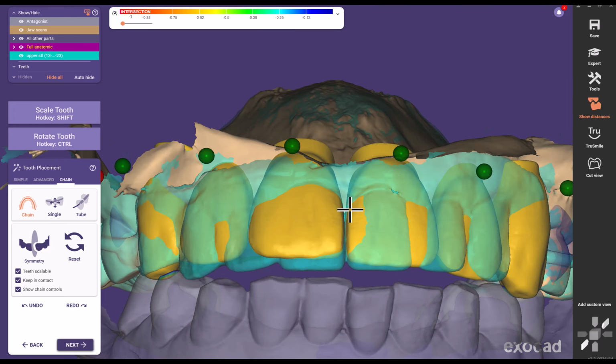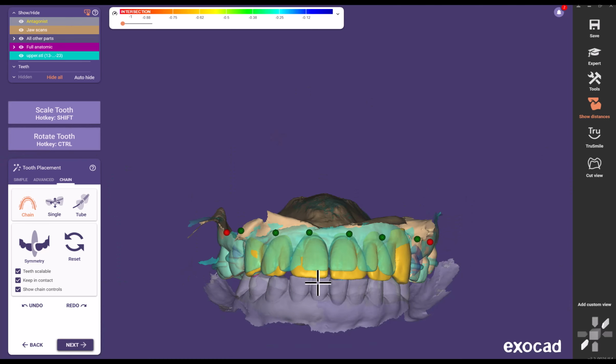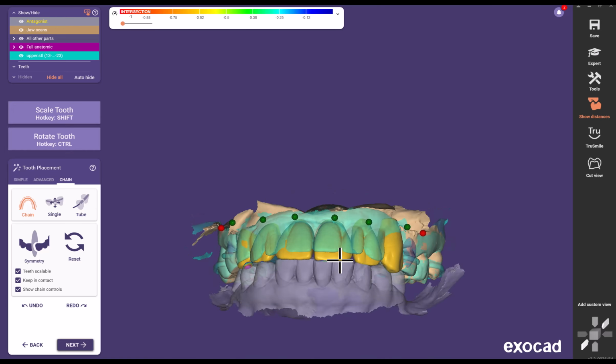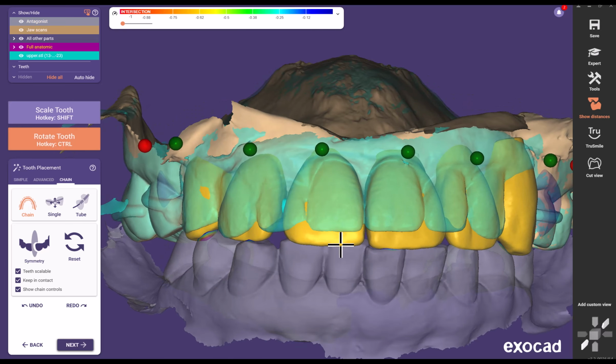And then we're going to need to bring this down, although I don't necessarily want to create a bunch of overlap and overjet. If this really is the bite, it's probably going to need to end up in more of an end-to-end relationship.